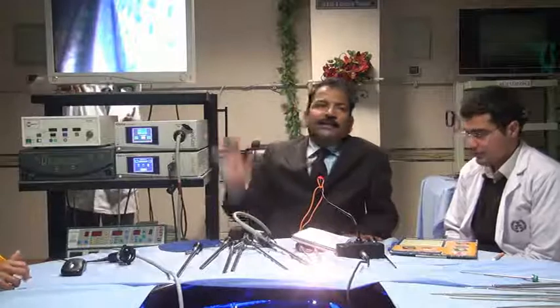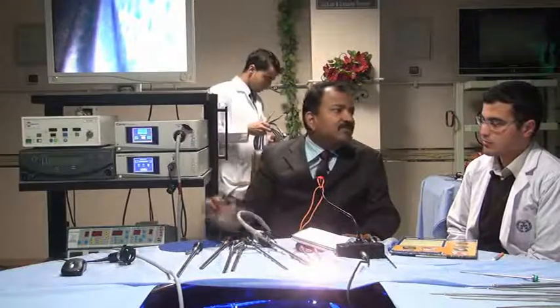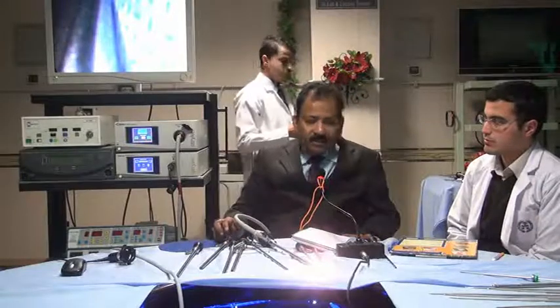And you should use 30. Here we always use a 30 degree telescope. We don't use this in our lab either: the Endotrainer. The Endotrainer has a fixed CCD camera. That doesn't give you the real simulation, real hand-eye coordination. A 30 degree telescope should ideally be used.